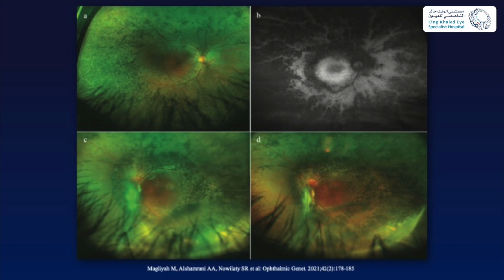In the other eye of the same patient, he has an inferior vasoproliferative tumor with tractional retinal detachment extending from the inferior retina to the optic disc. This patient received laser photocoagulation, and after receiving the laser photocoagulation, his TRD stabilized. This is after 1 year. So his TRD stabilized, the subretinal fluid resolved, as well as the lipid exudation.